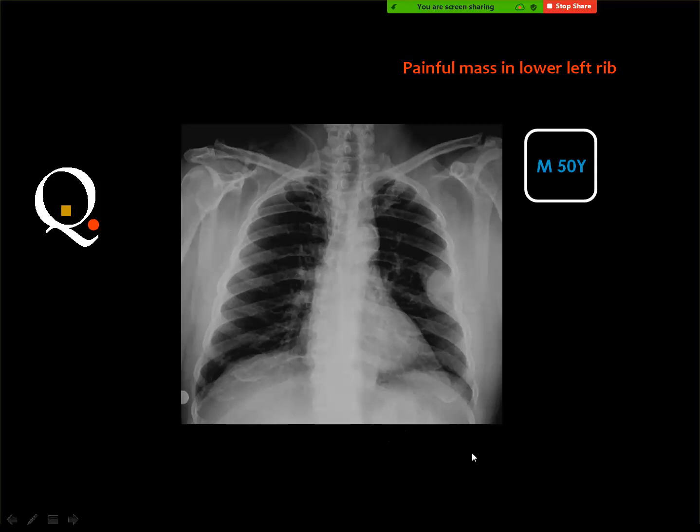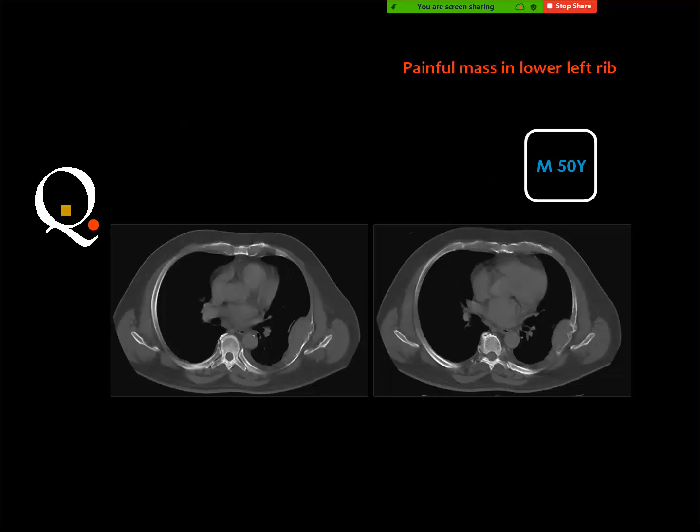If it is of pleural origin, what do you think? Could be a pleural mass like mesothelioma, if we think of a malignancy, or pleural cyst. Then what do you need for further evaluation? CT scan. Okay. It denotes that there is pleural thickening with destruction and erosion of the surrounding rib. Yeah. This is most probably Ewing sarcoma if it's in a young age, and mesothelioma in an old age.